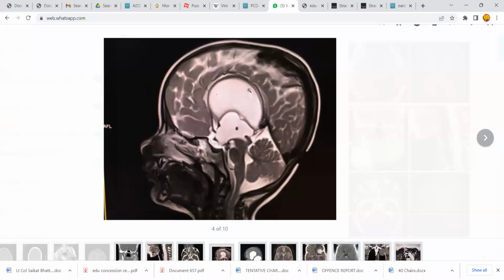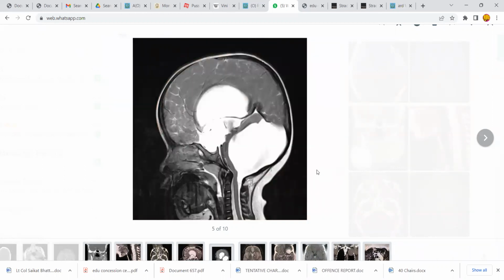Aqueductal stenosis causing hydrocephalus, dilatation of the lateral ventricles and the third ventricle, and non-dilatation of the fourth ventricle. So the obstruction is here. You can see a web or whatever. What is this? What's this? Third ventricle. What is this? This black part of the thalamus, yeah, the massa intermedia. This is the massa intermedia, the interthalamic adhesion. Yeah. Yogesh?